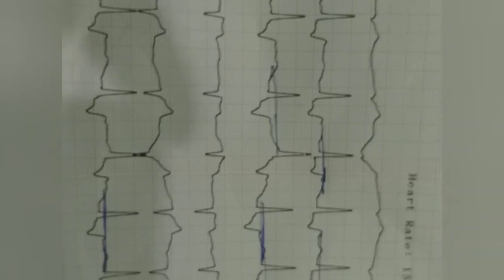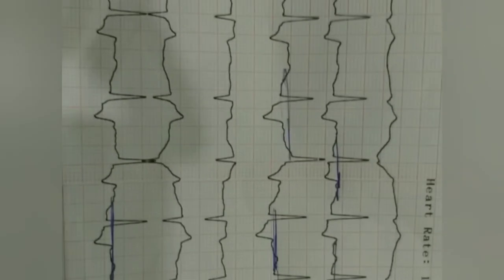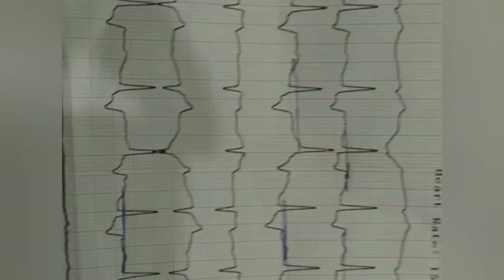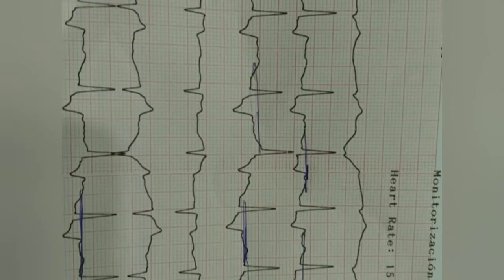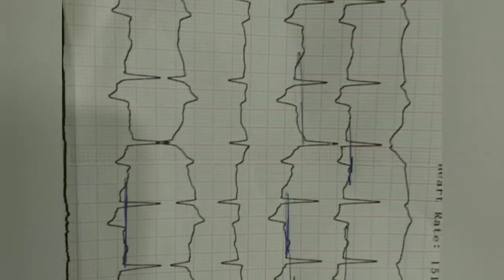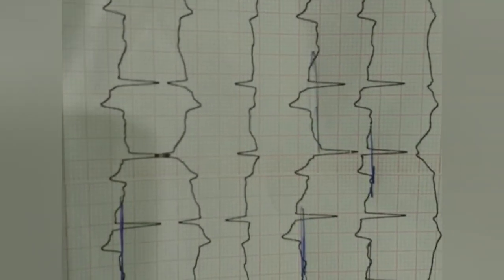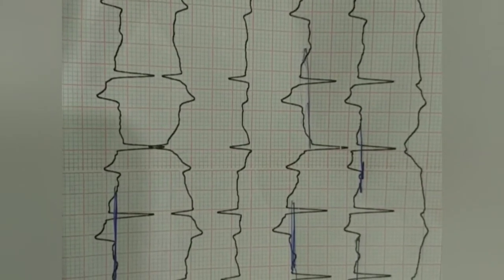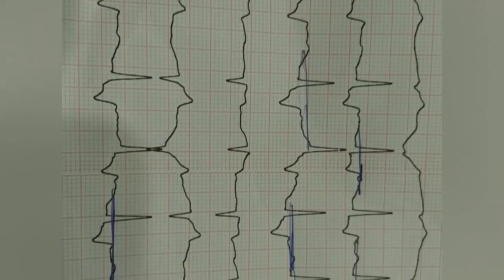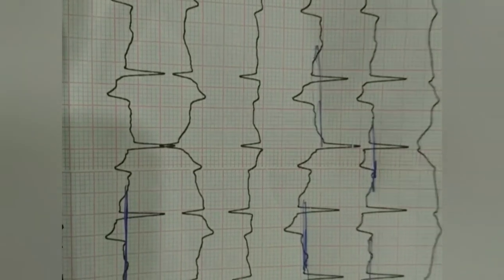So now here you can see that this patient is having ST depression in lead 2, 3 and AVF, and the patient was started on injection heparin, and was put on antiplatelets, which are disprin and clopidogrel, and was given an anticoagulant, which is injection heparin 1 cc IV stat. 1 cc of injection heparin is 5000 international units, and then the patient was put on an infusion of 1000 units per hour, and was monitored.